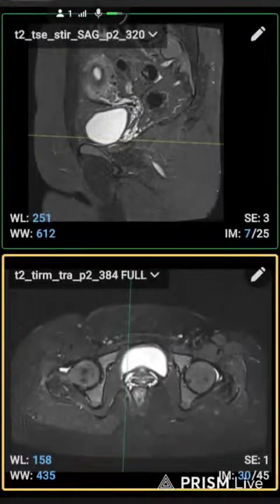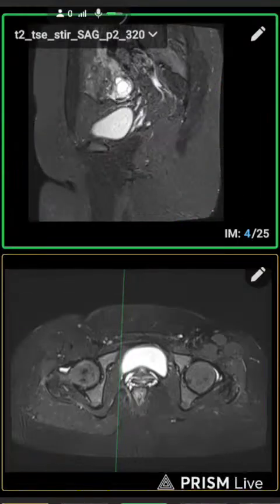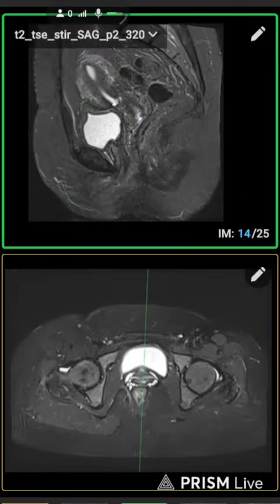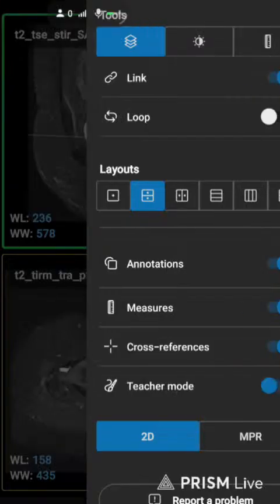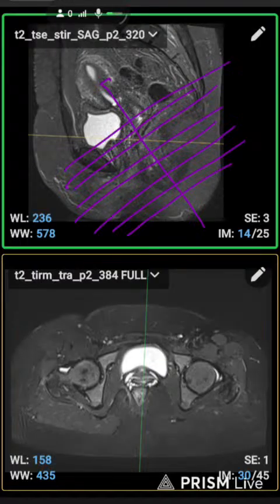The fistula was started from here to the end, so that we plan the axial scan started from above the starting point to the end point, or we also try to plan perpendicular to the anal canal. We will plan the axial 90 degrees to the anal canal.